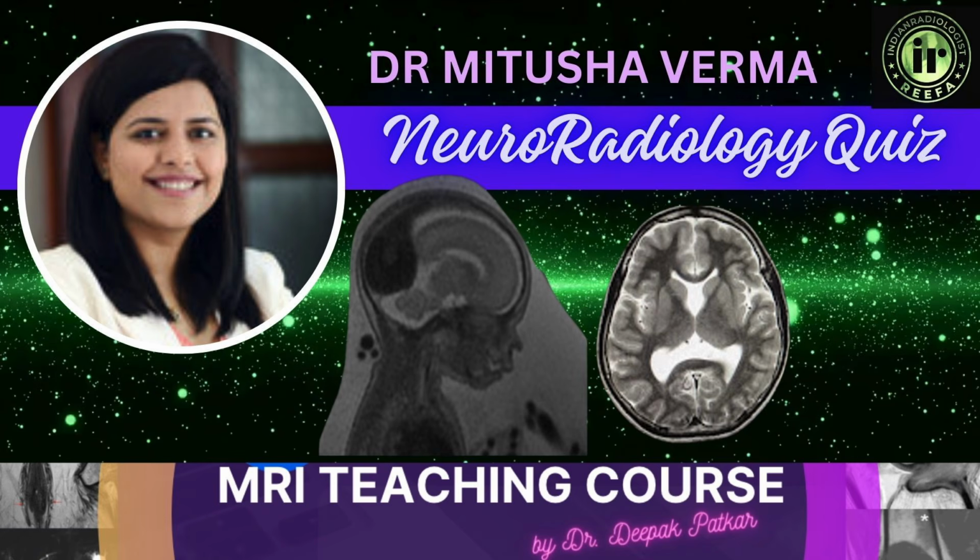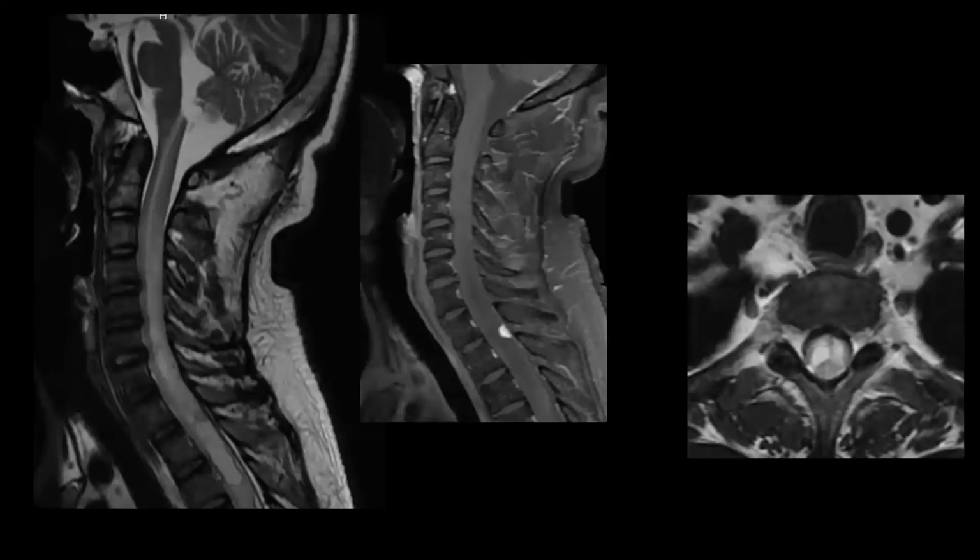So let's move to the first quiz, which we had broadcasted on various groups and social media platforms through Indian Radiologist. This was the first case which we had shown, where you can see a small intramedullary lesion which is hypo-intense on T2 weighted images with a lot of perilesional edema in the spinal cord, and on post contrast you can see that it is enhancing as a small nodule.